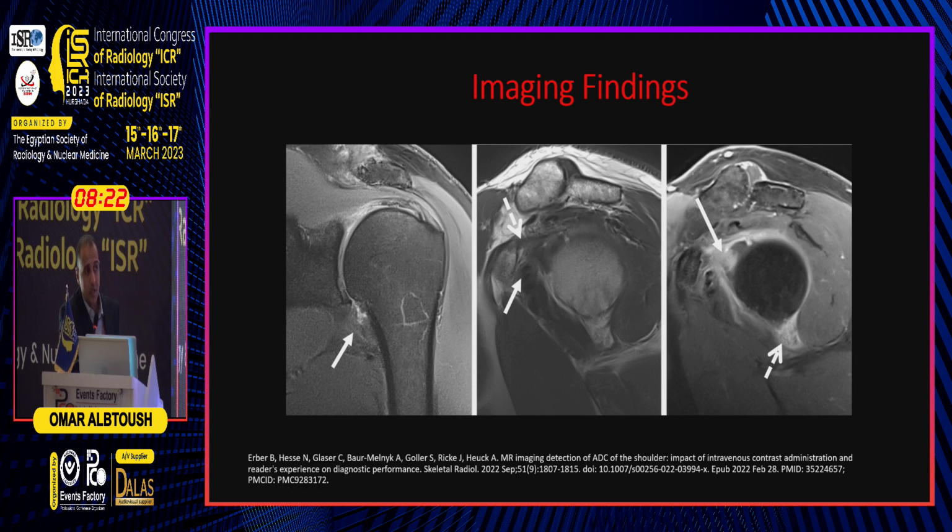This was post-gadolinium. As you can see here, we have enhancement. Of course, this is without contrast. Here we have enhancement, as you can see. And we have also heterogeneous enhancement at the rotator interval.